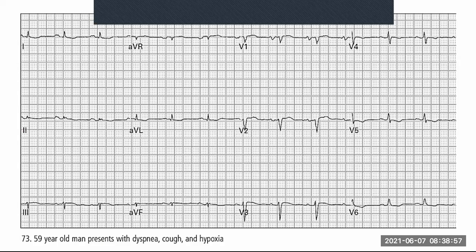So our patient could have CCF. Our patient could have a pleural effusion. Alternatively, could have disease of the lung. All right. Fibrotic disease of the lung. Anything that's preventing electricity from moving. Right. So we haven't seen this going on.